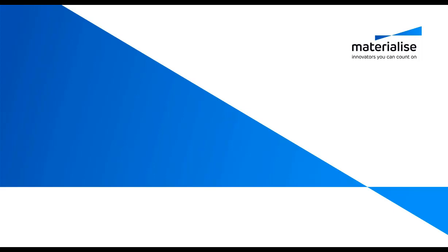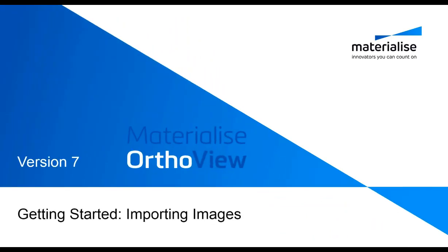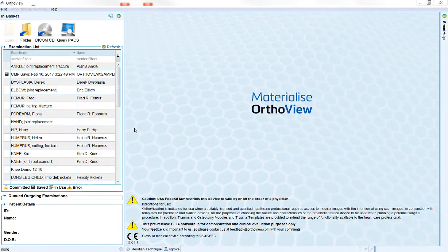Welcome to this short training video from Materialise OrthoView, where we will cover the options for importing your images into the software. When Materialise OrthoView is loaded as a separate application using either a desktop icon or browser URL, there are three main methods of importing images into the software.